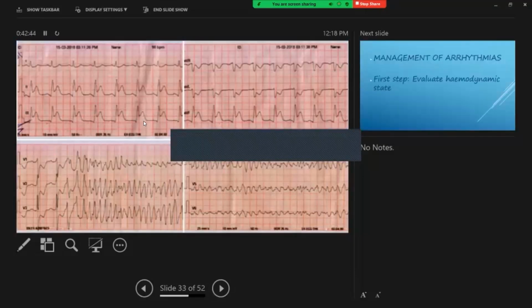Now this ECG is an abnormal ECG. You can see sinus tachycardia, and here at the end there is ventricular fibrillation. This patient had suggestive chest pain followed by cardiac arrest while getting the ECG. So let's analyze the ECG according to those steps. First step, analyze lead 1 and aVL. So there is ST segment depression.